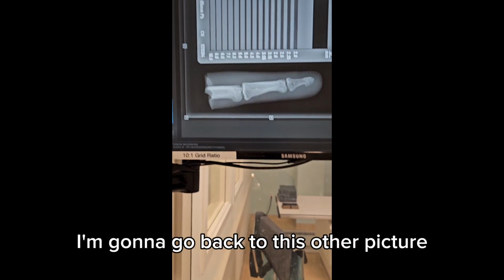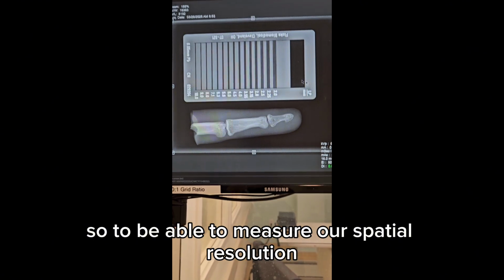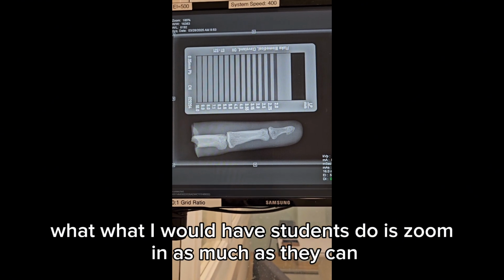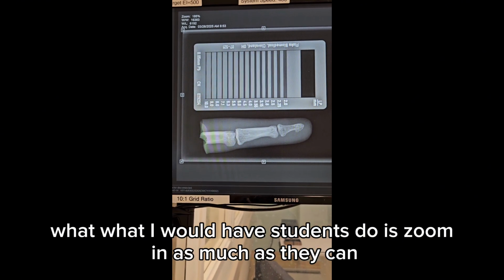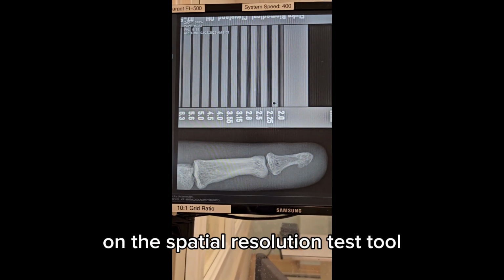I'm going to go back to this other picture just because, no, I'm going to leave it on this one. So to be able to measure our spatial resolution, what I would have students do is zoom in as much as they can on the spatial resolution test tool.